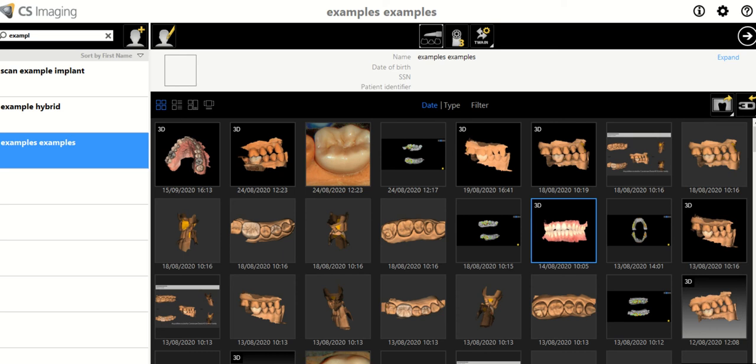So in front of you, you can see lots of thumbnails. If it shows a 3D icon in the top left corner, then it's an intraoral scan. All the other thumbnails are screenshots and photos, because when you're scanning you can save HD intraoral photos, and they could have a real clinical benefit or technical benefit for the lab to see those photos. Send photos of the discolored prep, for example, or adjacent teeth to be copied.